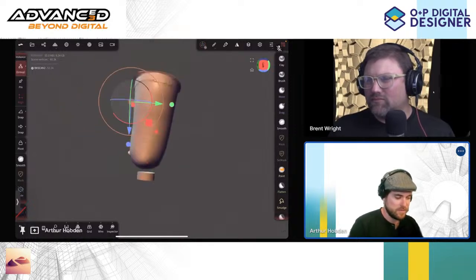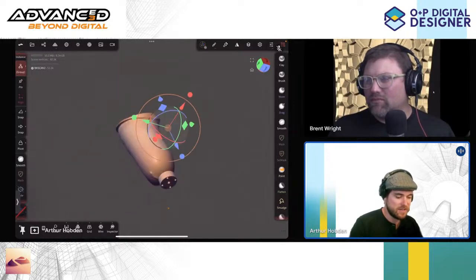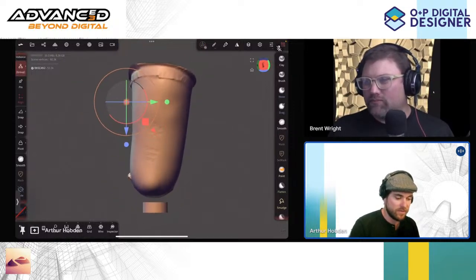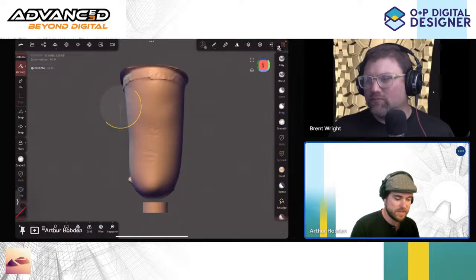And now I'm wondering if benchtop alignment is necessary at this stage, but we can do that at any point in the stages, right? I always say that even in Fusion, at the very end, you can still adjust your alignment, but just generally aligning to the world space, I think, is a good practice overall.